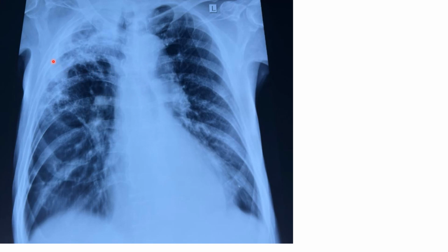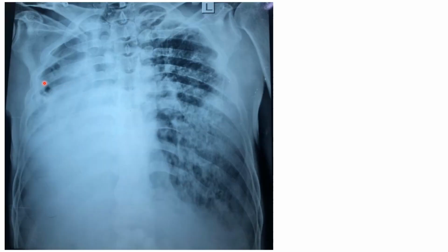In this X-ray again, look at this, so white, and this trachea is also pulled up here, to the right side. So there are some fibrotic bands up here, so this is also a fibrosis. Likely this is a fibrocavity. This is some sort of a cavitation because some air is there, some space is there. Other areas are fibrosed, and you can see that the trachea is shifted to the right side, and then you can see this area, this is all fibrosis. So parenchymal fibrosis is here, right? It has completely destroyed this lung, but here there is some element of fibrosis too.